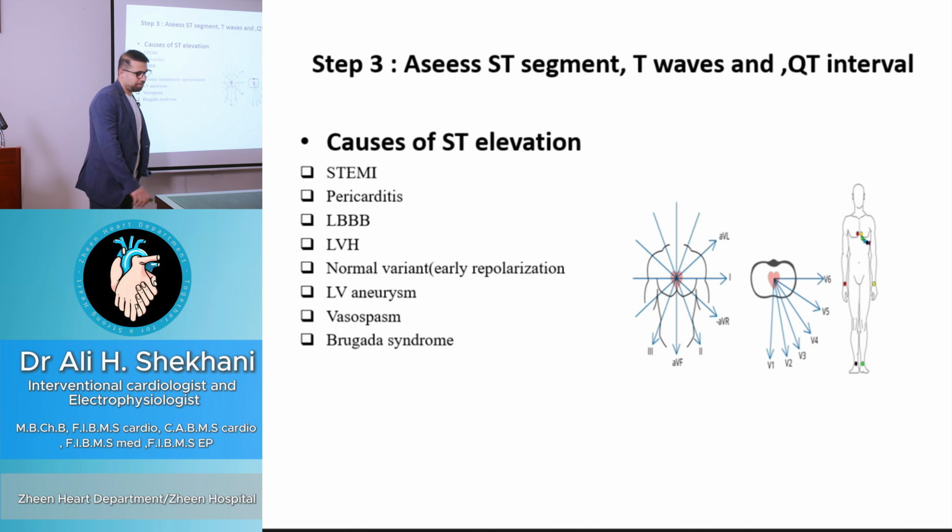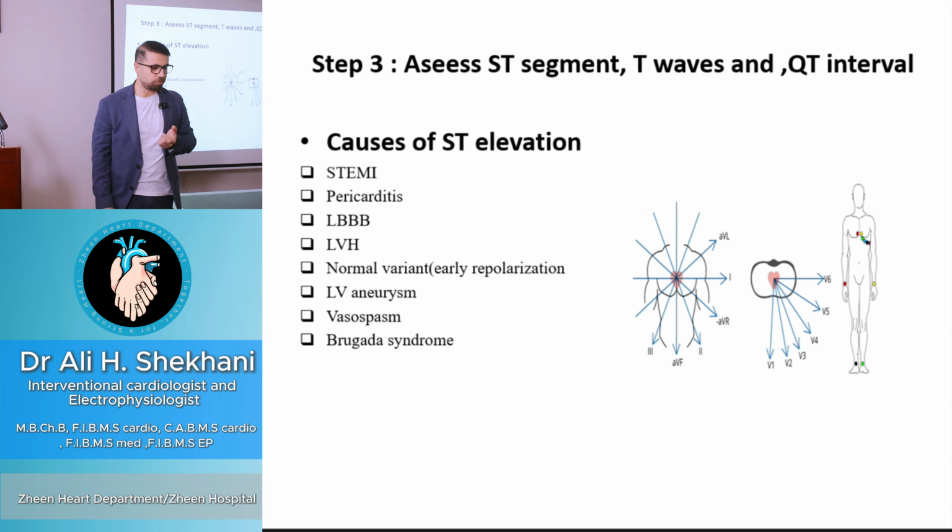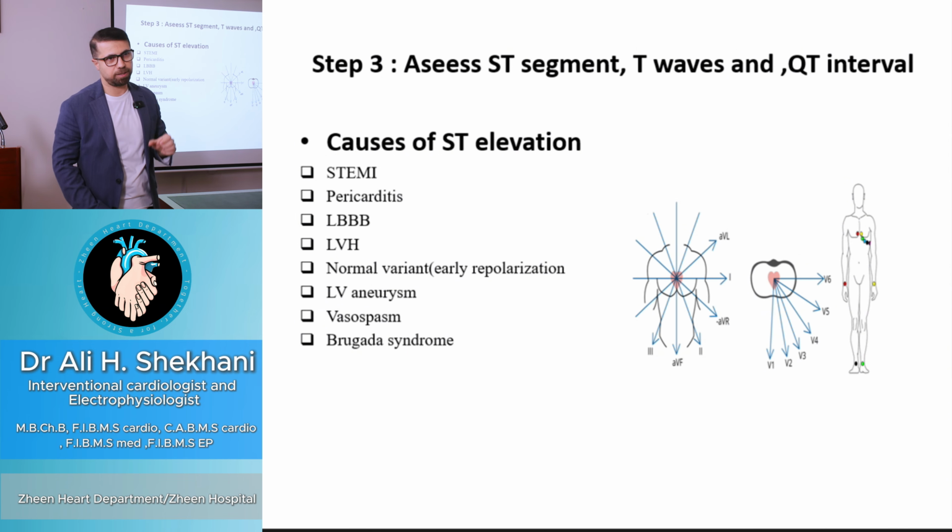Okay, another important part of the ECG is to assess the ST segment, T wave, and QT interval. We have several causes of ST elevation. Not every ST elevation is due to myocardial infarction, but every ST elevation should be taken seriously.